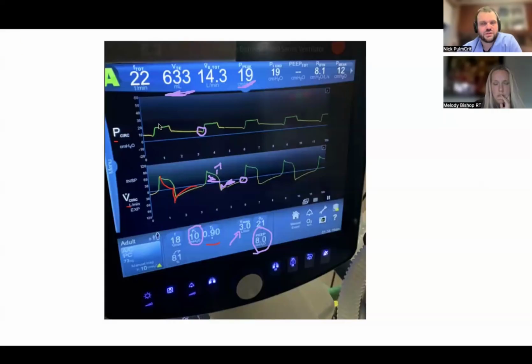As we discussed before, the biggest bang for your buck is to lower the respiratory rate. Now you notice the respiratory rate's not really even that high; it's only 22. So that goes back to the original thought, which is, does the patient have emphysema or COPD, where the compliance is so high that for not much pressure change, you get a big volume. Based on the mechanics of the lung, they might not be able to go above a certain breaths per minute, and that could be different for every patient.